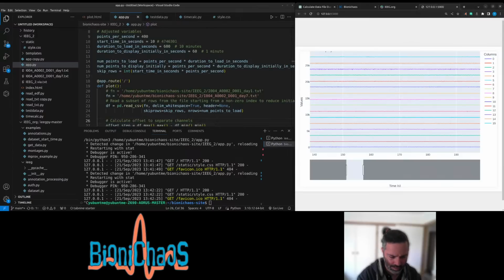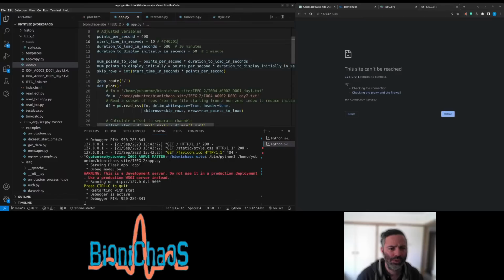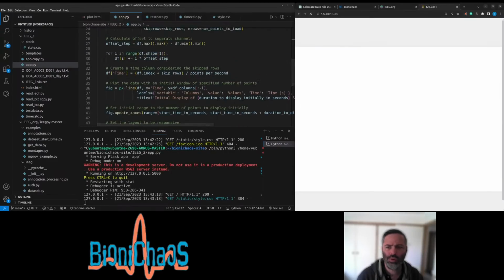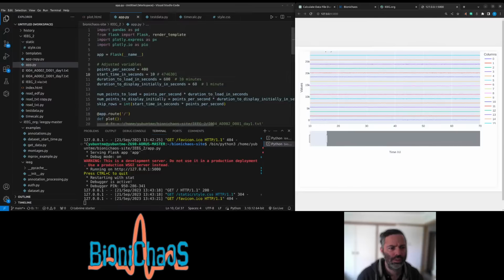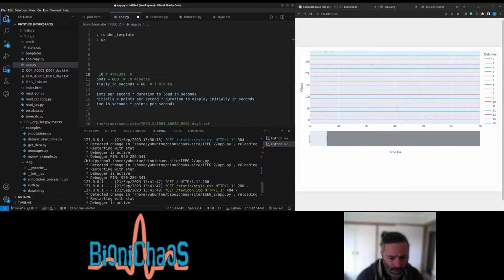Started at 10 seconds there. Right, so this number should be... Where is that number?